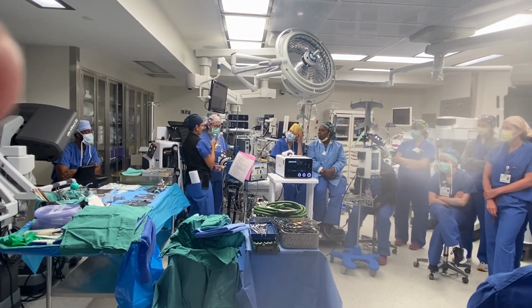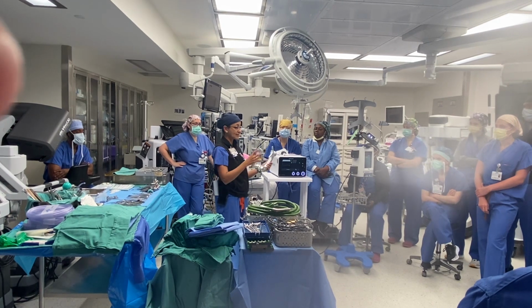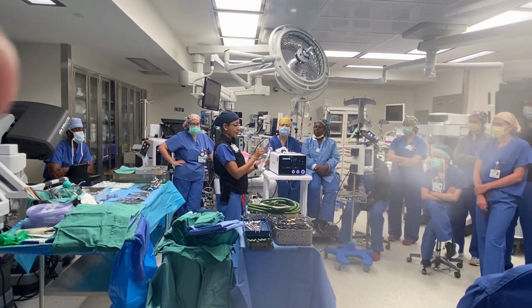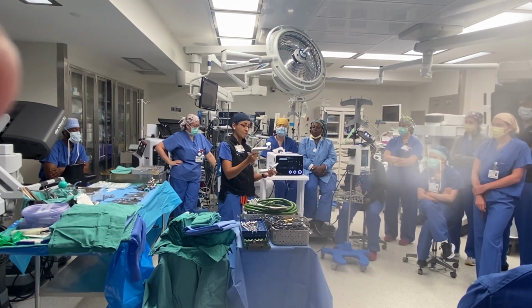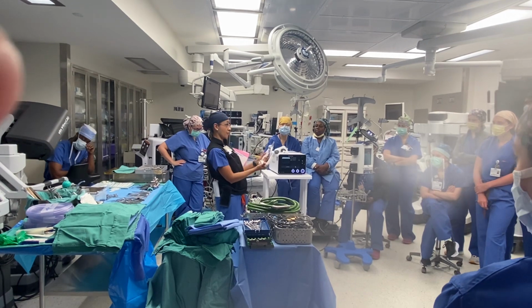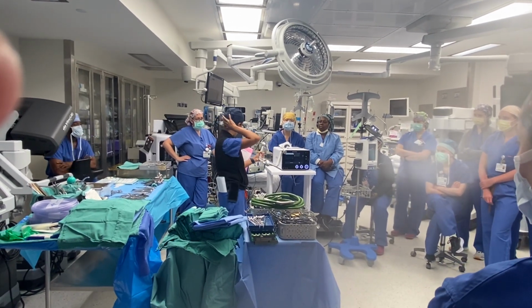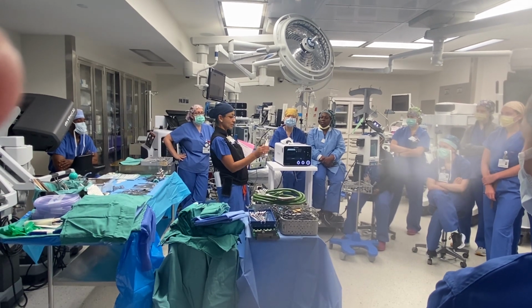Alternatively, we will sometimes pin the head in Mayfield pins. You guys have all seen these. These get three pins, and then we decide how we're going to do that based on where the problem is. All of our prone cases, all of those back of the head cases, are always going to use these pins. So this is an important setup.